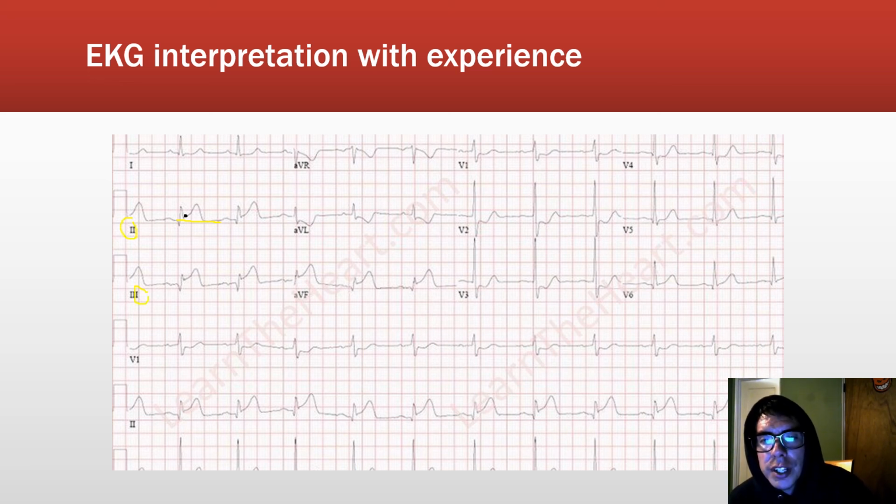So they're having a heart attack down there. We have reciprocal changes in V2, V3, and V1 maybe. Otherwise, no other abnormalities that I can see at least. So I'd call this an inferior wall myocardial infarction, and it's likely to be blocking the right coronary artery.